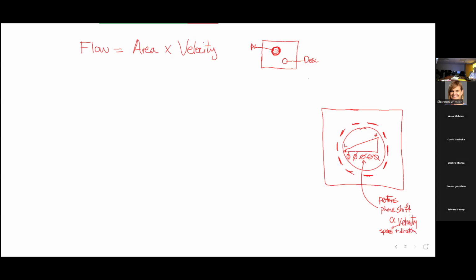So let's go back to our cine movie and how are we going to do that? Okay, so we're going to make our cine movie here. We have up here the target, and we want to get the ascending aorta. And so we've got to measure it across the cardiac cycle. So we're going to have to go back to our movie making.